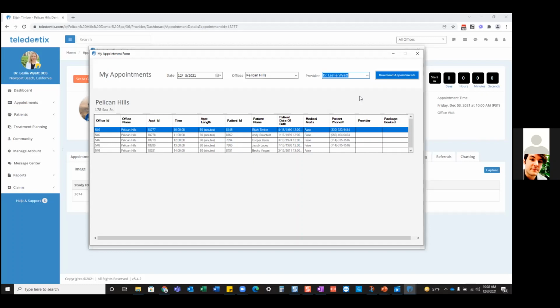Each and every patient that is on my scheduler is going to get their very own routing slip and capture sequence, okay? I don't have to pre-select the template. I will have the exact same functionality that I showed you previously when I was online: ability to edit, ability to tag, ability to delete, ability to retake. I have that exact same functionality when I'm offline. And we're so excited for this, and I'm sure you guys are too. So this is all it is.